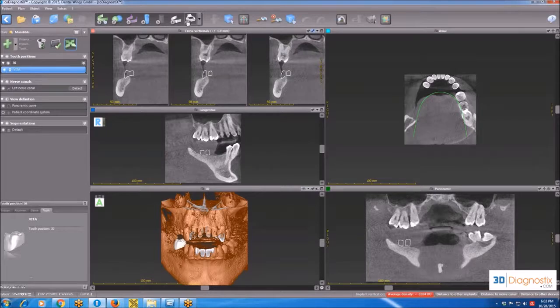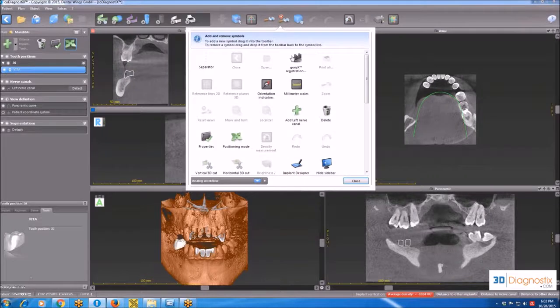On the top panel of the screen, we have a couple of icons. Those 7 on the top left are fixed, and the rest of the icons could be different in newer versions of the software. Over here, you could right-click on the Adjust tab and drag any of these icons to the box or out of it to the top panel. You are going to be familiar with which icons you are going to use a lot and which icons need a shortcut and which you won't need, and you can just drag it to the box below.